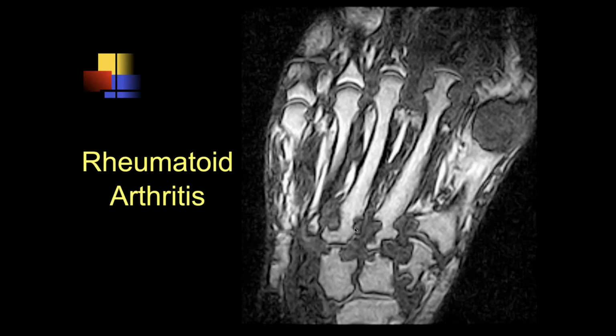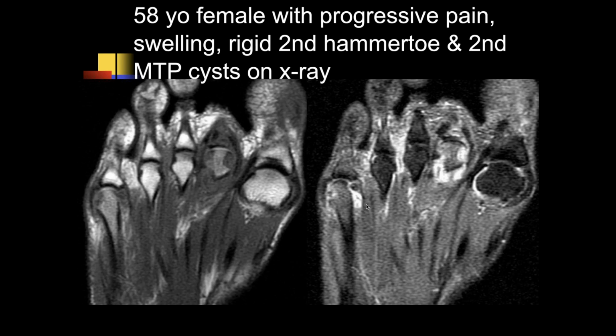No, that's not true. So this is a patient who had known rheumatoid arthritis, and you can see these multiple erosions and the synovial thickening associated with the erosive disease.